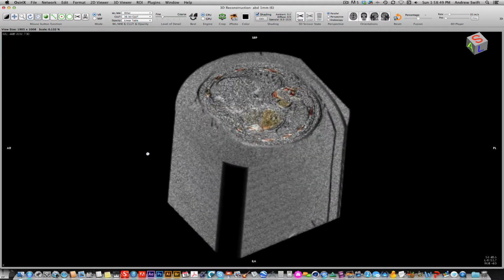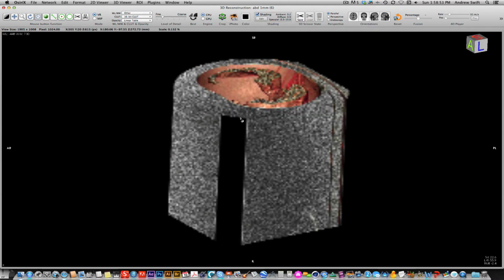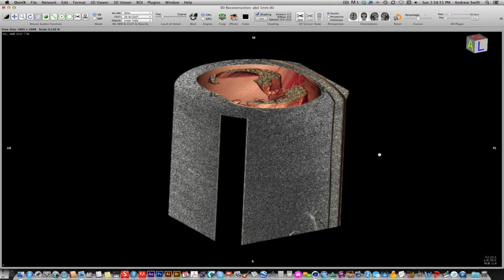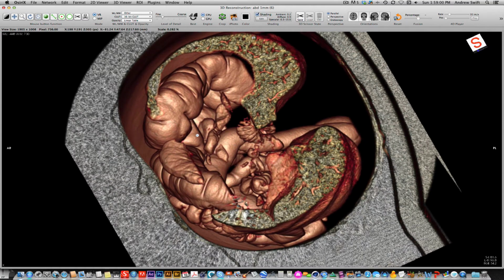And this is what we've got. Now it's hard to see at first, but it's all there. So I'm going to adjust the window leveling. I'm holding down Option and just clicking and dragging up. And so this is the air inside the bowel.